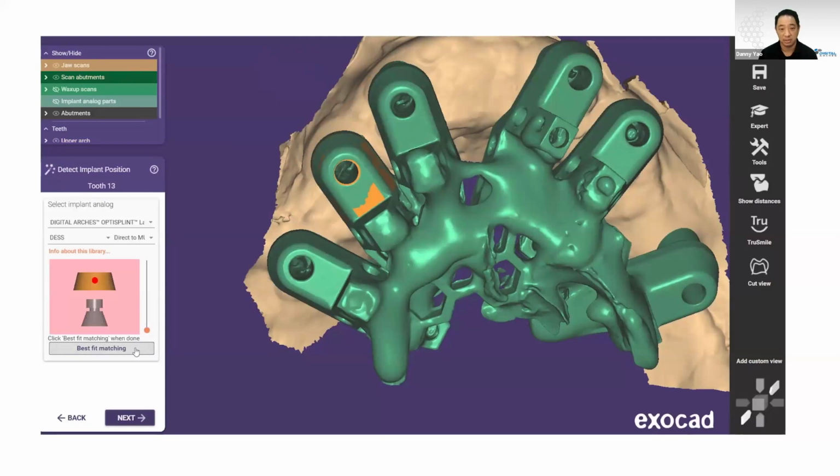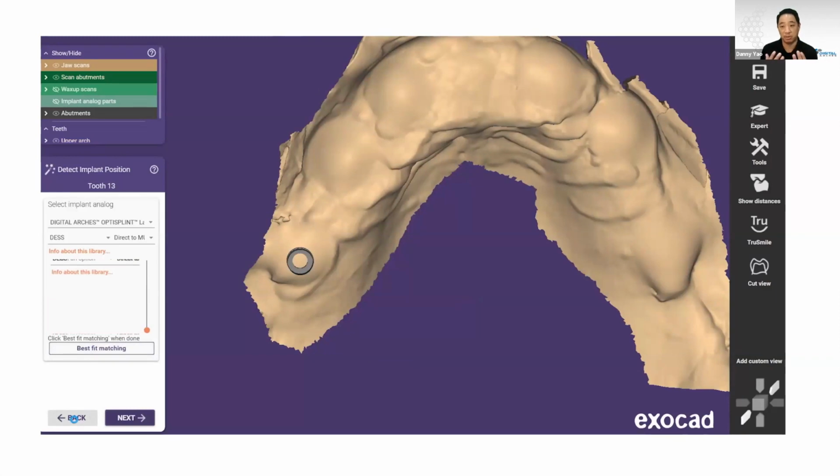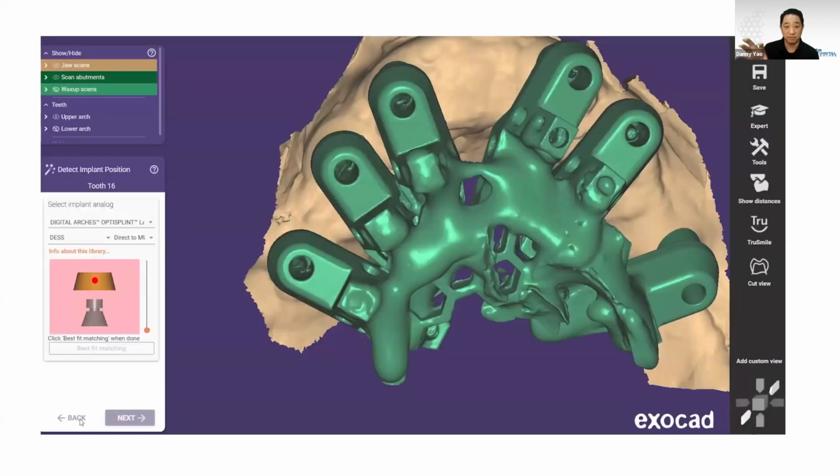And this is actually a good indication of what happens when you're doing your alignments. Now, we aligned this tissue scan as our jaw alignment at first, and then we moved this tissue scan to the bite scan.